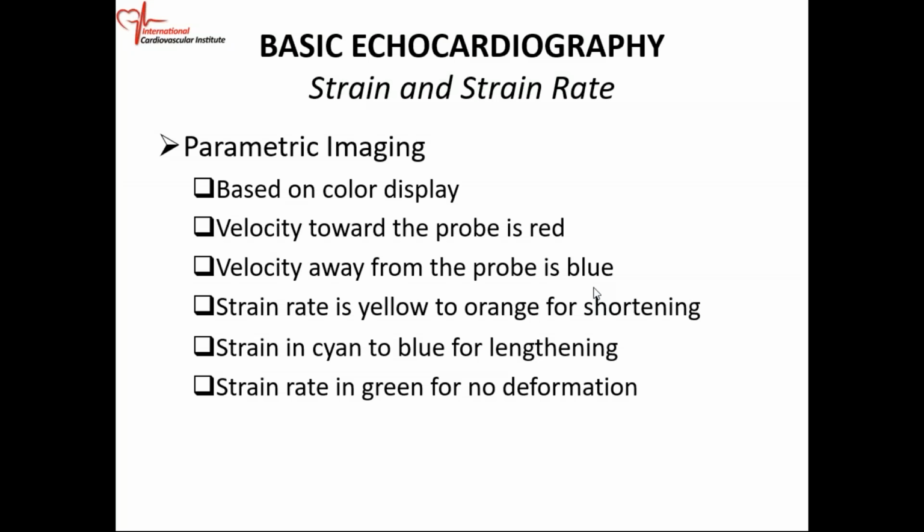So we're going to segue from strain to looking at the parametric imaging. And it's based on the same type of principle. Okay, so you must have seen apical four-chamber views, probably short axis view of the heart, and there are colors all over the place.